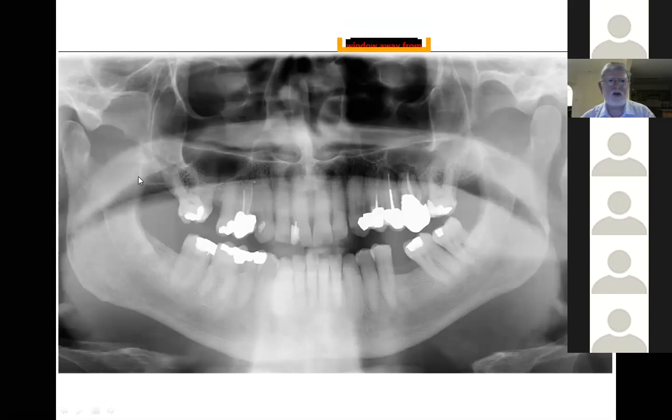So, yeah, you can see this is a massive tooth. If you were hoping to do a straightforward forceps extraction of that tooth, it's just not going to happen without you breaking something, because the maximum width is from there through to there. How are you going to make something that wide come out through something that narrow? It's just not going to happen without something giving. You don't want to be bringing out a whole lot of bone with that.